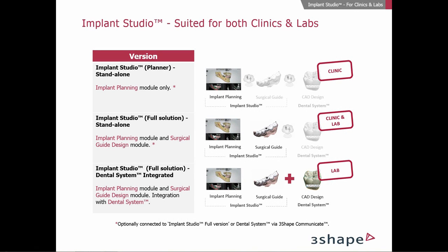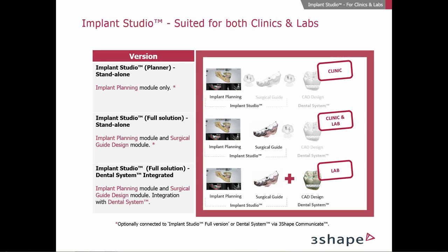3Shape's new software, Implant Studio, gives you the possibility to do implant planning and design surgical guides for guided implant surgery. Implant Studio is available in 3 different packages for both clinics and labs.